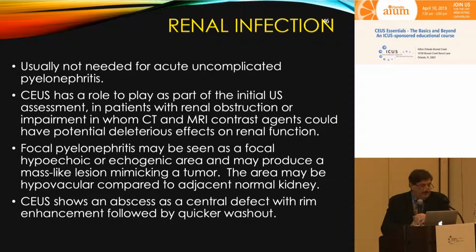They're usually treated without imaging. But CEUS has a role to play as part of the assessment in patients with renal obstruction or impairment, in whom CT and MR contrast could have potential deleterious effects on renal function, when we're looking for an abscess. So focal pyelonephritis may be seen as a focal hypoechoic or echogenic area and may produce a mass-like lesion mimicking a tumor. The area may be hypovascular compared to adjacent normal kidney, and CEUS can show an abscess or central defect with rim enhancement, which has a quick washout.